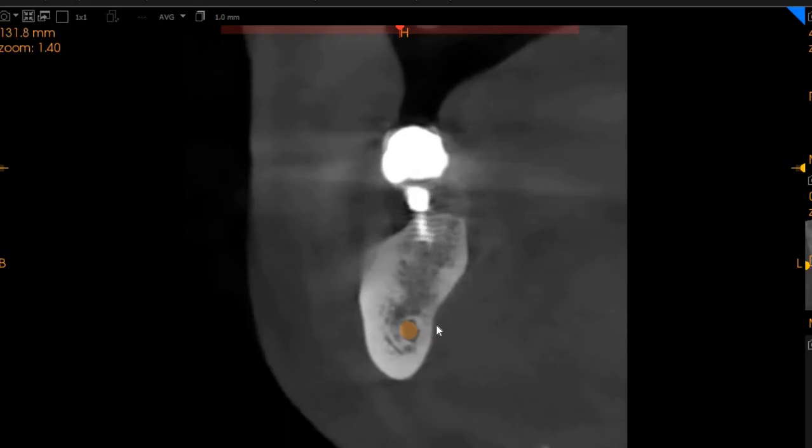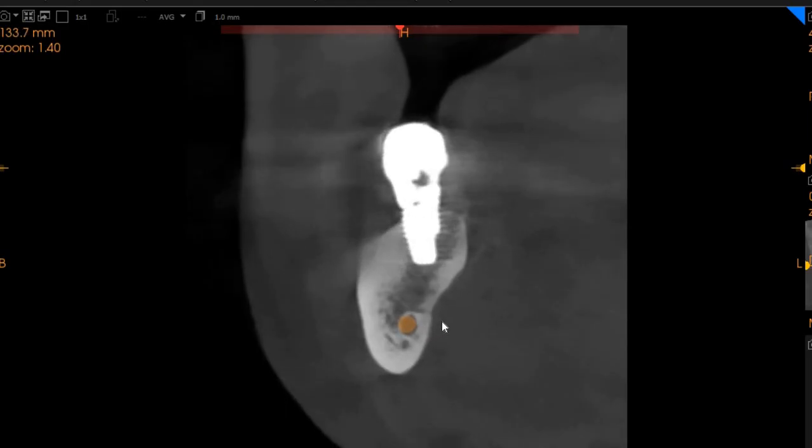This is the implant on the second molar region. This implant again has slightly better bone levels, as you can very clearly see on buccal and the lingual aspect. Does not have as significant bone loss as the rest of these implants.